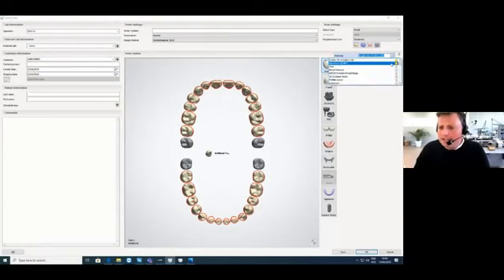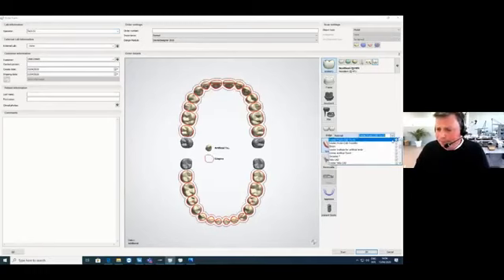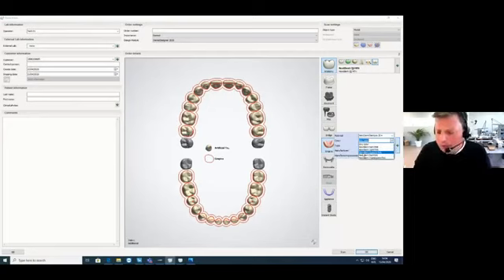So here I will choose the NextDent material, the crown and bridge MFH. It's a great feature in the 2020 software of 3Shape that you can highlight or make favorites in your materials. So I will set up the color and it's already set to the manufacturing process for the printer. Then I will choose a gingiva and I will go into my favorites and you will see here the NextDent Denture 3D Plus material. I will set a color. You see there are 5 colors available. I'm a real big fan of the opaque pink. And then you see already the NextDent manufacturing process is highlighted.